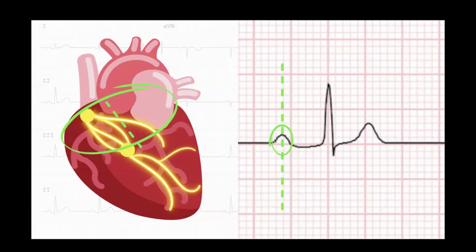One day when we get time, we'll do another video on advanced ECG stuff, but it's not uncommon to see notched P waves, or one side bigger than the other side. That's just because the person has enlargement of one of those atria, whether it's the left or the right. It could be engorged from being overfilled by too much volume, or enlarged because the muscle has gotten bigger over time to compensate. But this positive inflection here is your P wave. It's atrial depolarization. The SA node fires right here, creates that ripple effect to the atria, and sends a signal down to the AV node. So over and down.